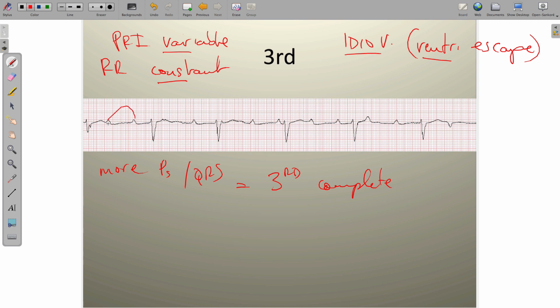How do we have sinus rhythm? Because we have P waves, they're upright, they're rounded, and they're occurring at a rate of 300, 150, 100. It's actually, you could even call this sinus tach. We can call it sinus tach or sinus rhythm. So we could call this sinus rhythm with third-degree heart block so far.